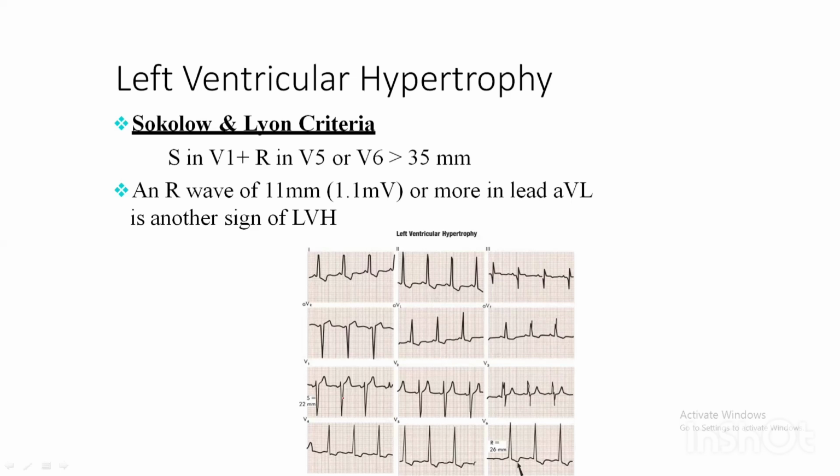Can you add here? Here it is shown. This is the R wave in V6 and this is the S wave in V1.